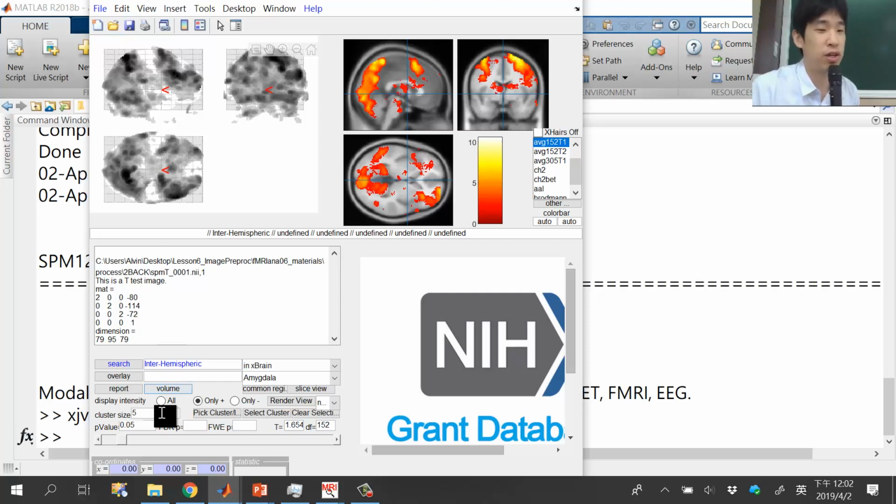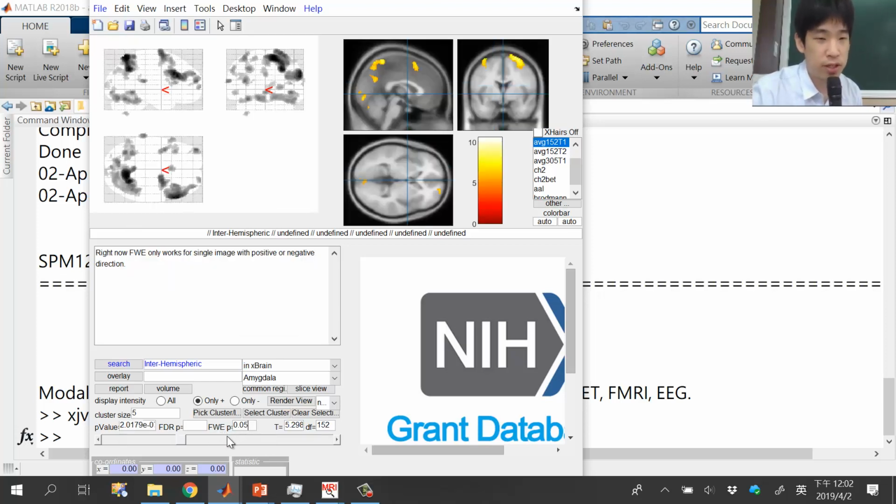It's pretty weird. So now you can actually use the FWE, just like what we used right here. And you can see, just press enter. And you can see there is another one, FDR. If you know FDR, false discovery rate correction, you will know FWE is the most restrictive one.